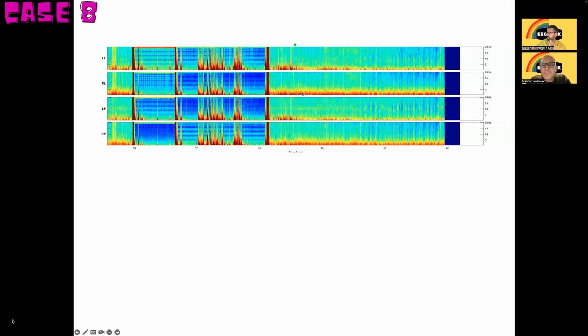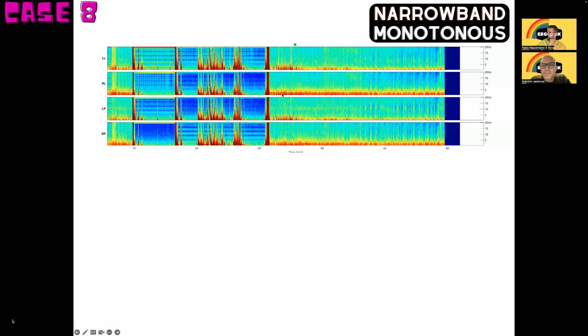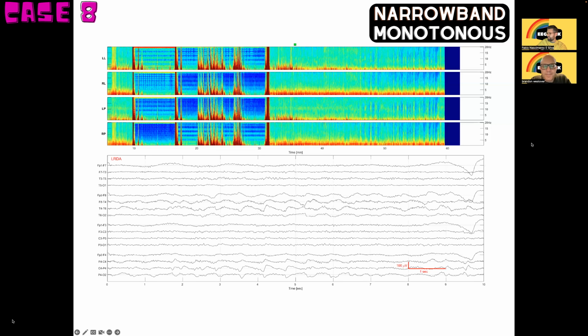More on the right, so it's focal. It's kind of narrow and a little bit spiky, but not too much, still narrow. So it could be right-sided LRDA, or what else? Or it could be just focal irregular slowing. Okay. I'm going with you. I bet it's LRDA on the right. Okay. Should we have the honor? Let's do it. Ah, sure enough. Right-sided LRDA. Got it. Beautiful.